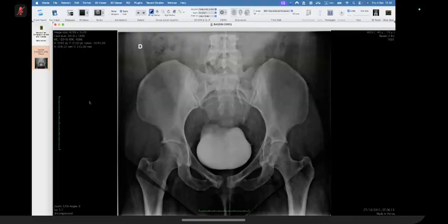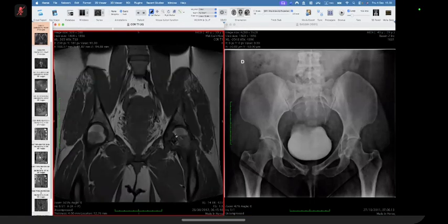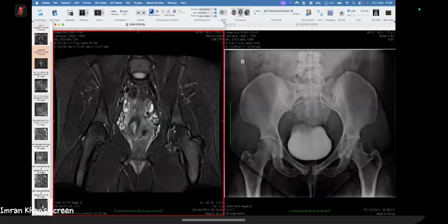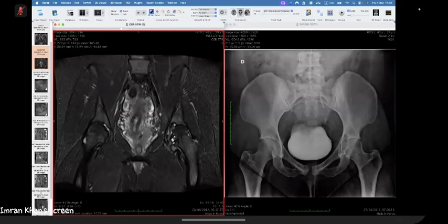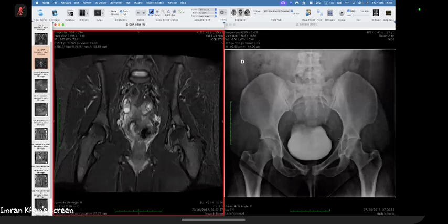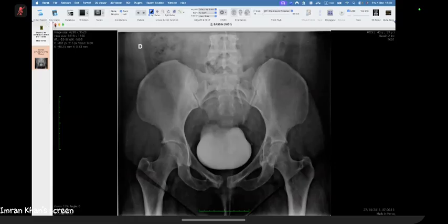So what is it? Pigmented villonodular synovitis? Correct. This is PVNS. You can clearly see the same findings involving the femoral head and the acetabulum. This is PVNS. So if you see erosions at the joint with preservation of the joint space till the end, eventually it will collapse, but that occurs very late in the disease, so that is PVNS.